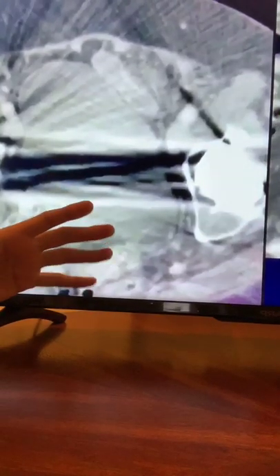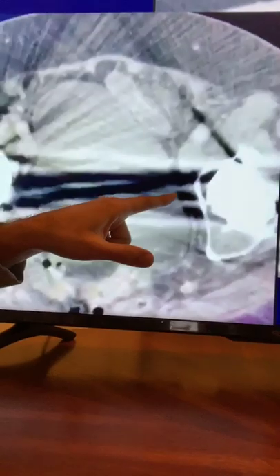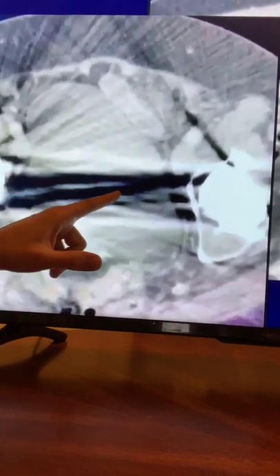You're going to get this type of artifact on CT whenever metal is around. There are some other things that can cause this too, but if you see metal, you're going to get this streak artifact. It's basically that your photons can't get through, and there's a lot of physics behind it. You can have beam hardening. Sorry, time for water. So get used to seeing this streak artifact. It can kill your dictation when it comes to looking for stuff.